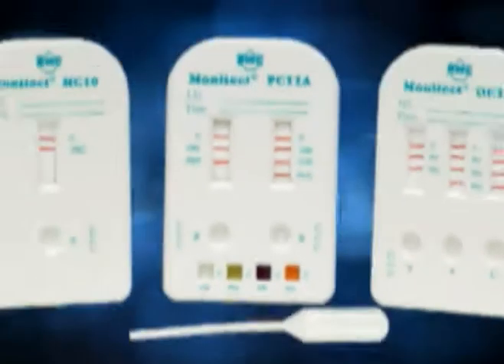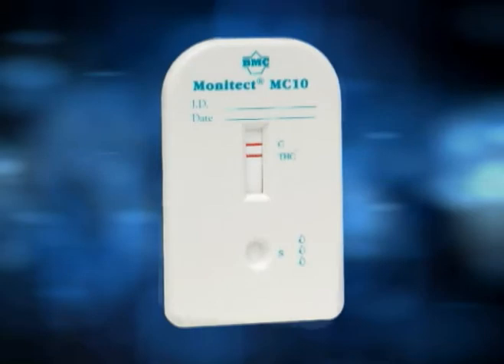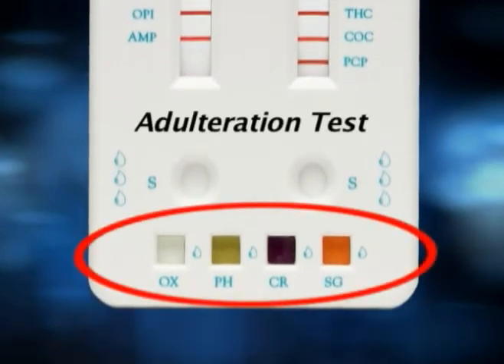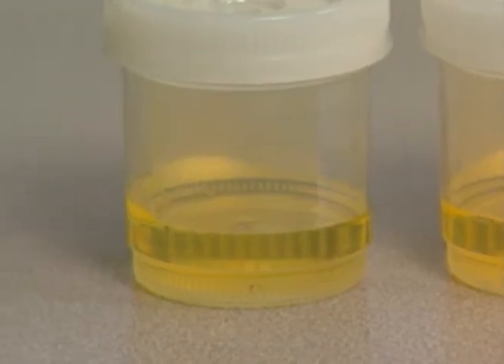Monitect drug screen cassette is offered in various configurations in formats from 1 to 8 drugs. The Monitect cassette may also contain adulteration tests to determine the validity of the urine sample for contamination prior to drugs of abuse testing. The Monitect drug screen cassette test is formulated for use with freshly voided human urine.